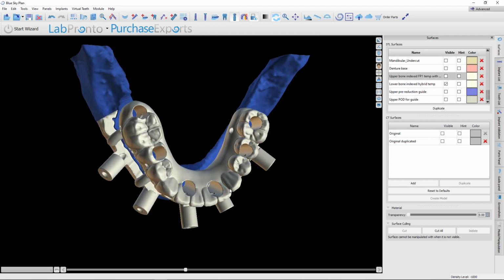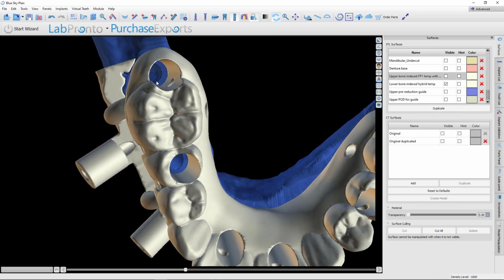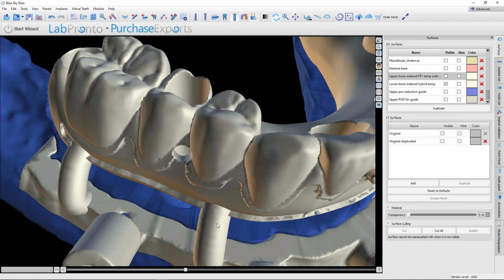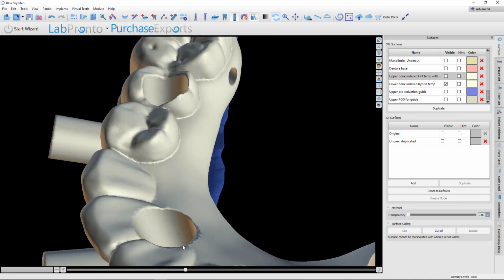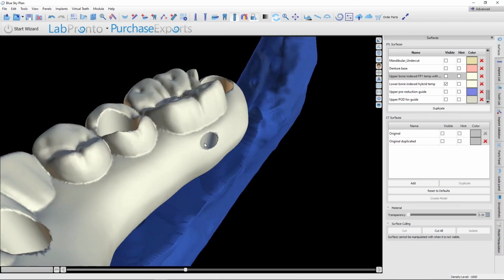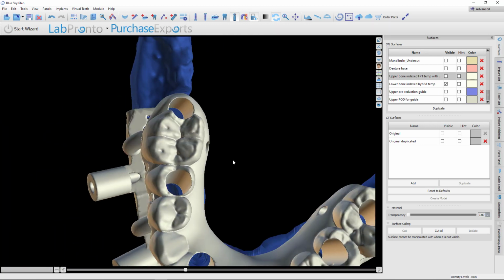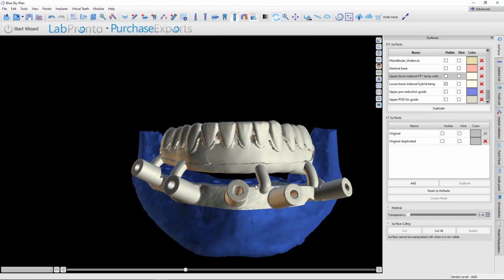Being that the lower is more of a traditional hybrid shape, again, you can see the holes are pre-subtracted out. We've also got the same little holes that are going to be used for filling with a syringe of acrylic. On the distal ones, it's hard to get in here from the buccal, so that hole is made from the lingual. Just squirt your tip in there, and that will fill everything to pick up your cylinder.